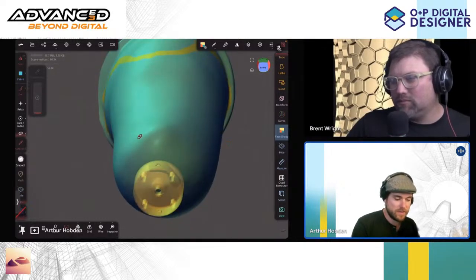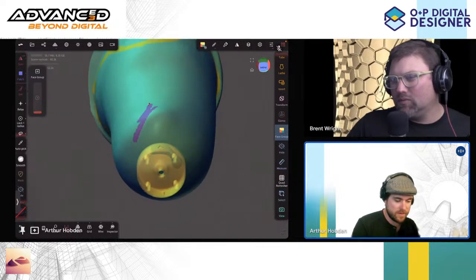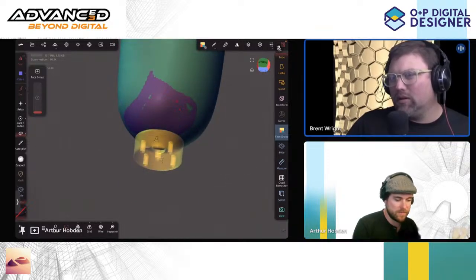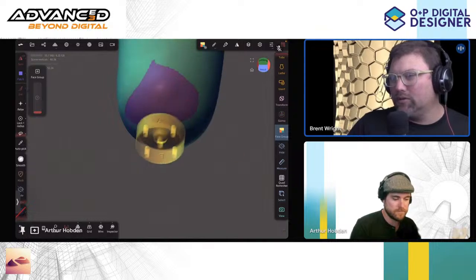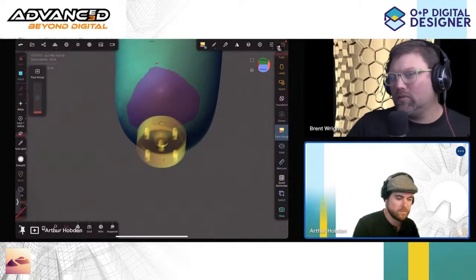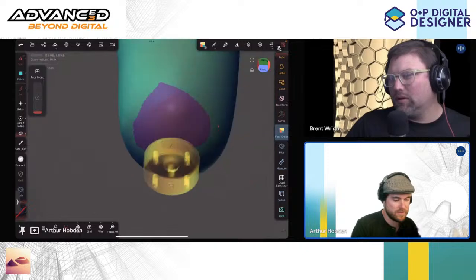So into this area here, change to the correct color, and find the right one. There we go. In this area, if I remember correctly, it's sort of like a triangle shape, right? Yep, something like that, and probably not as wide on those corners. Okay. How's that? Yeah, right.